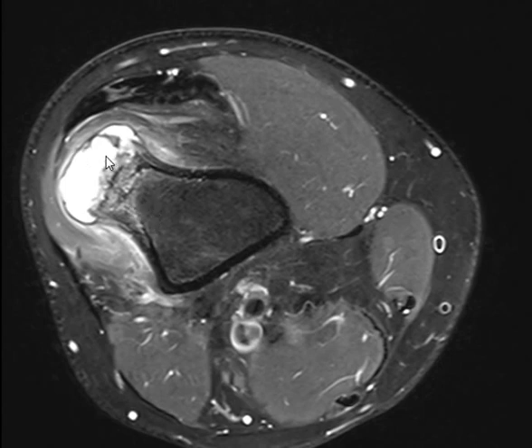But the cartilage is very thick. That's the most important thing. Yes, there is a thick cartilaginous cap. If it is more than 1.5, okay, risk of osteo. If it's more than 15 millimeter or 1.5 centimeter, it's a high risk for chondrosarcoma.